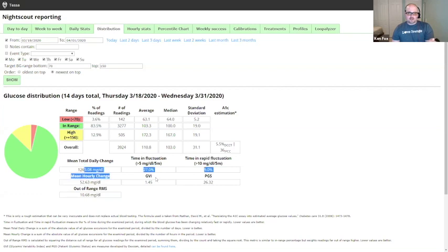A bunch of other data down here that I don't really always use. I mean, it's kind of cool to look at, and I try to look at what people consider good, which is cool. You can Google it and read some cool reports and things along those lines. There's a good article linked down here at the bottom that tells you about some of these variability stats. Not everybody reads it, but it's down there and it's really interesting.